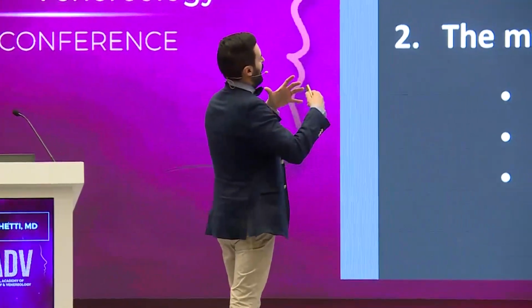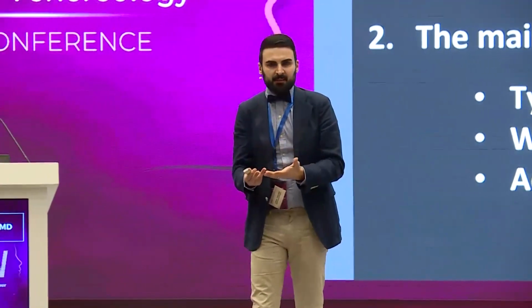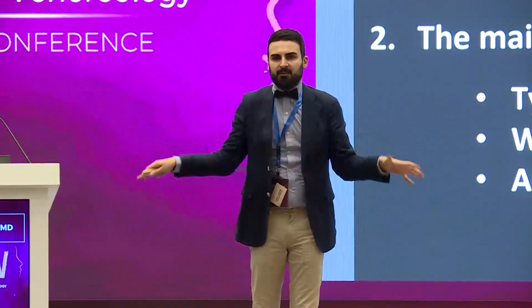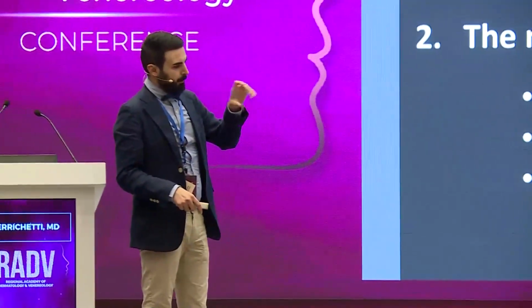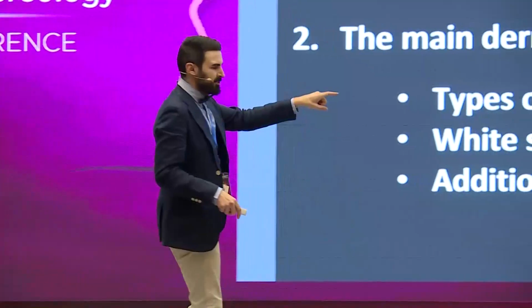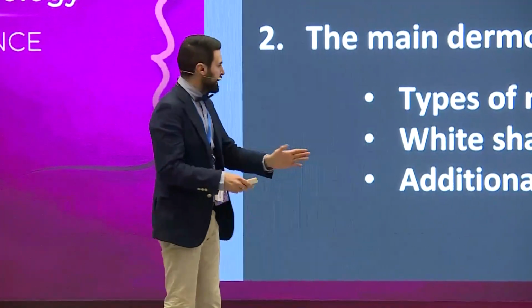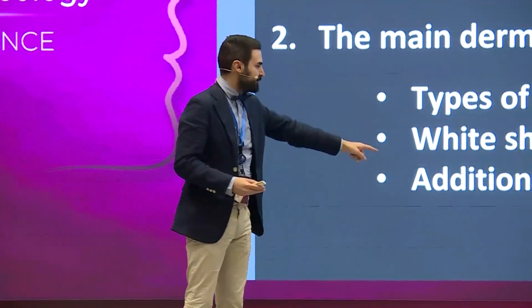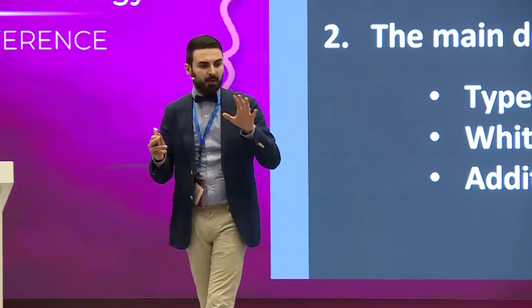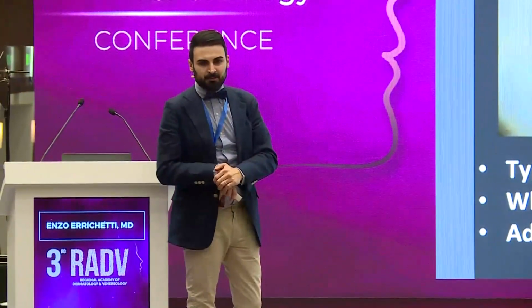So, the majority of hypopigmented dermatoses present with unspecific white structureless areas, okay? We have to analyze the margins of the lesions, if they are sharp or not, the shade of the white, but it's difficult, but most importantly, we have to see the additional dermoscopic features. Let's see, achromic pityriasis versicolor.